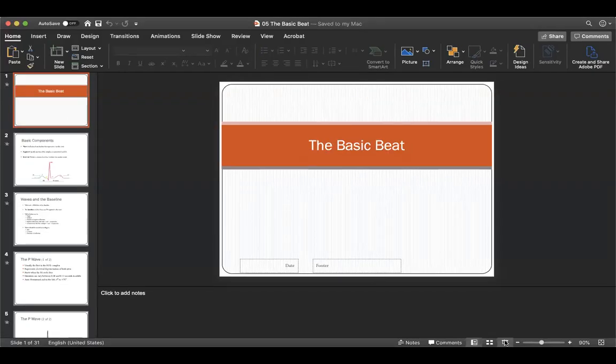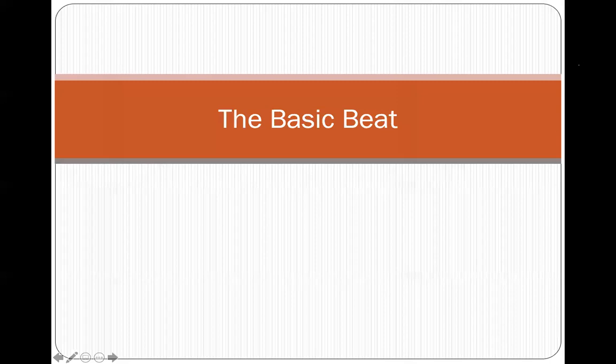All right, future paramedics, one more video here to talk about EKG for this particular session, or this particular day of activities. Let me share the screen and let's talk about the basic beat. Okay, so the basic beat, you know some of this already, and you'll remember some of this from your AMP class, but let's be really specific and get into some of the details on the basic beat, okay?